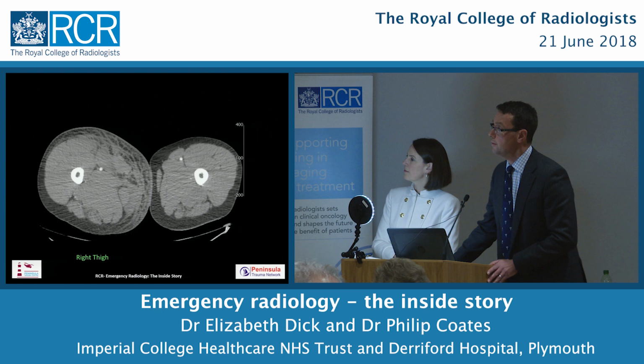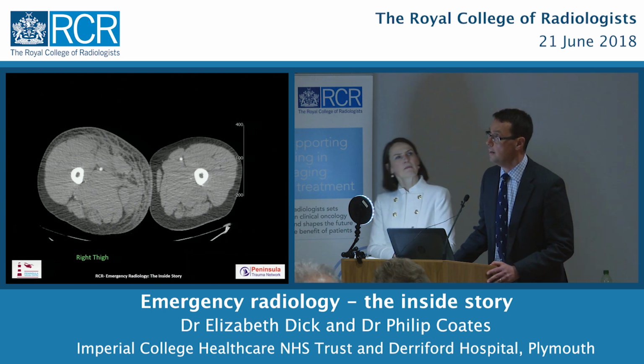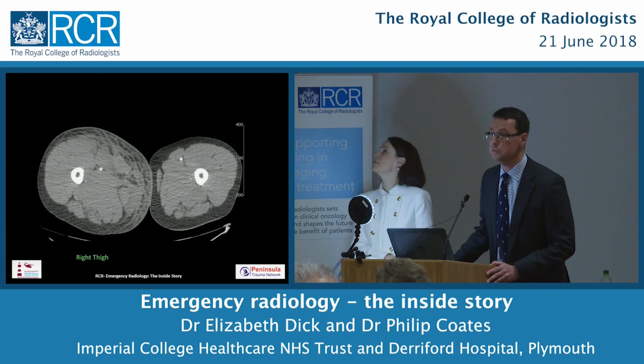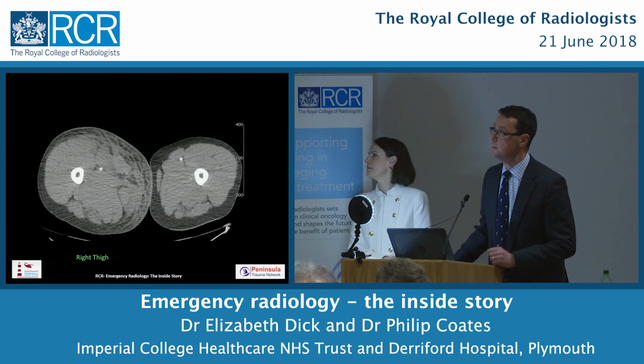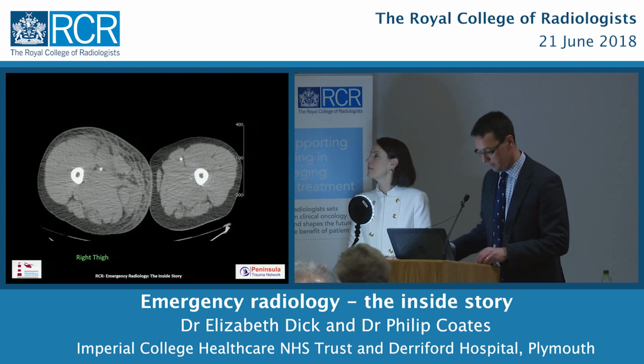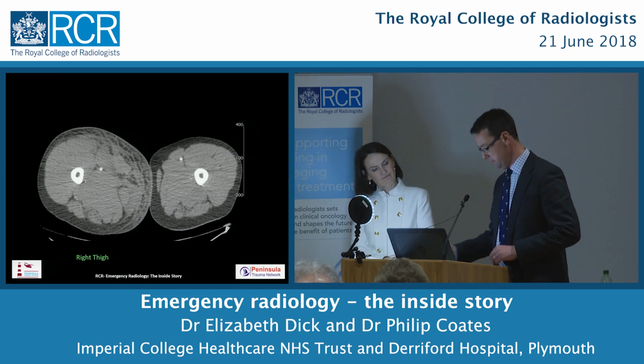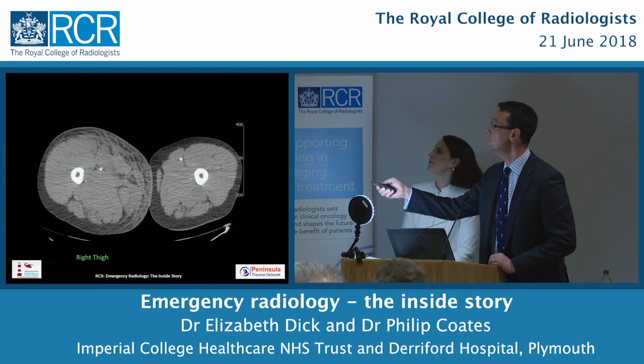Now you can see the right thigh, which we've labelled there, is actually quite significantly larger than the left. And if you look at the fat, which is the darker grey stuff on the periphery of the thigh, you'll see on the right side it's got that furrier look to it, so it's slightly irregular. Now that's hematoma, that's blood in this case. You see just around the periphery there.